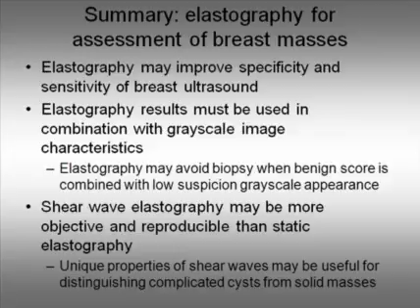And as compared to static elastography, shear wave elastography appears to be more objective and more reproducible. And in fact, the unique properties of shear waves, since they don't propagate in fluid, may also help us distinguish among the many hypoechoic masses that are cysts and distinguish them from solid masses.